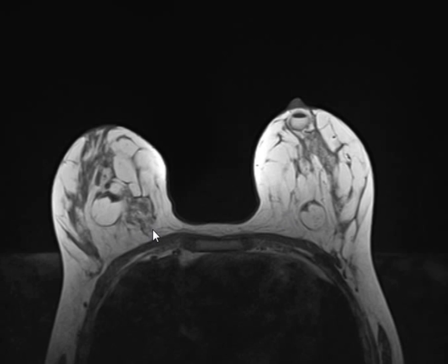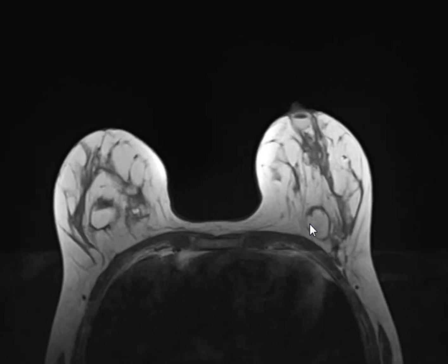So the fat should not be suppressed because it's not fat saturated. You say fat suppressed or not suppressed on a fat saturated image. So from the beginning, we have bilateral multiple breast lesions that appear well-defined, and appear isointense. Iso to what? To the breast tissue. Glandular tissue of the breast? Breast fat. Okay, because there is glandular tissue, there is fatty tissue. So it's iso to the fat on T1.